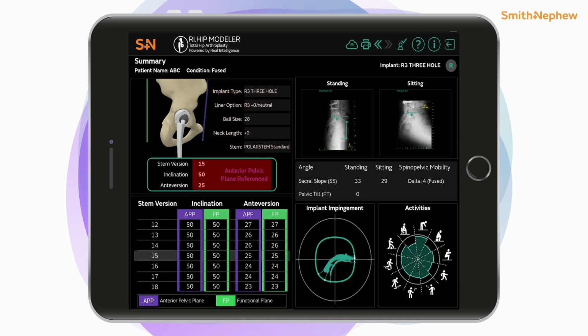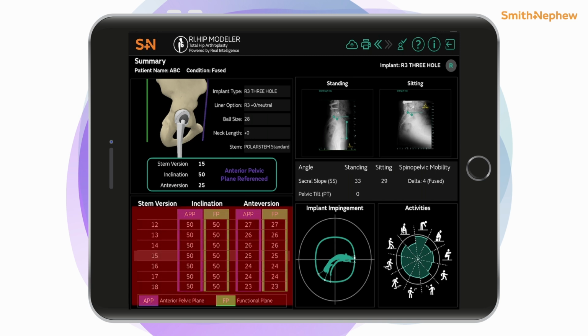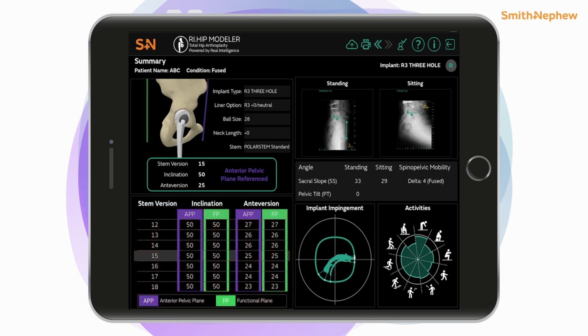It shows us what our stem version is and the inclination and anteversion of our cup, goal of our cup position. We can see down here in this box that it gives us some variations in femoral anteversion. 15 is set as a standard, but if you feel like there's a slight change, it gives you different options of where your cup can be placed if you feel like there's slightly less or slightly more anteversion.